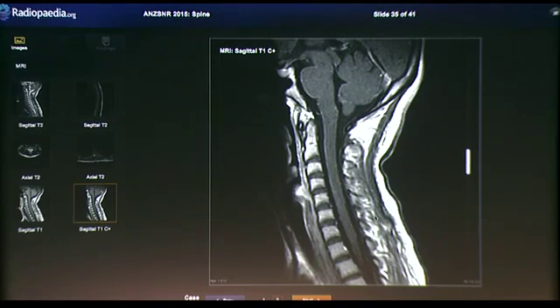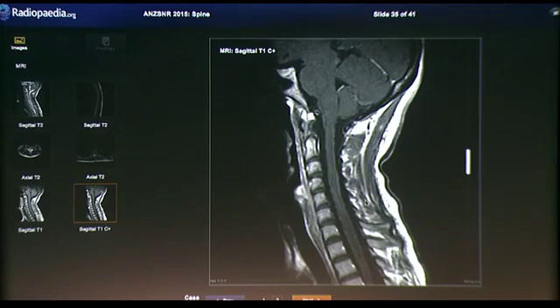However, on the contrast enhanced sequences, you can see that there's all this leptomeningeal enhancement, even up into the posterior fossa, without convincing enhancement within the cord itself. So these demyelinating conditions, NMO, don't tend to be associated with leptomeningeal enhancement. The autoimmune inflammatory type conditions like SLE and also infective conditions are the sorts of things which I'd be thinking of when I see a transverse myelitis looking cord in association with leptomeningeal disease.